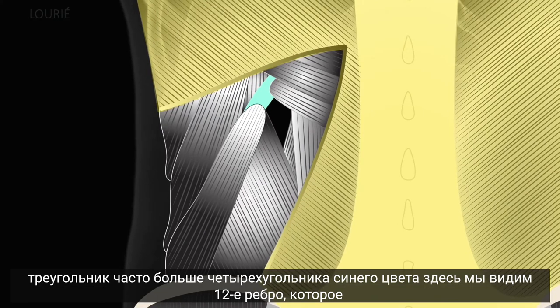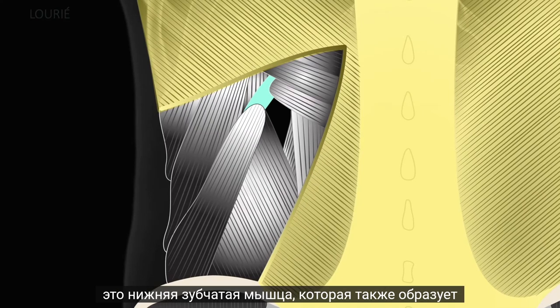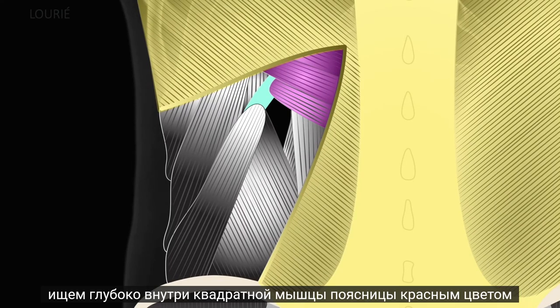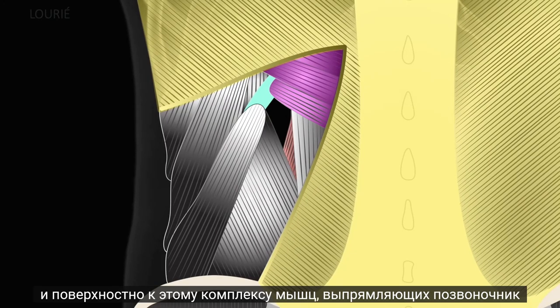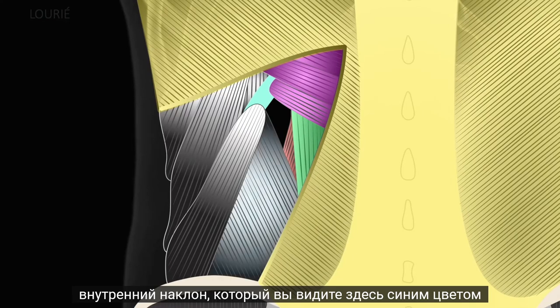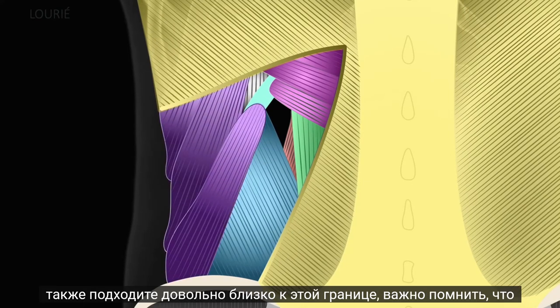In blue here we see the 12th rib, which forms its superior border. There is a serratus complex, in this case the serratus posterior inferior, that also forms a portion of this superior border. Then medially, we look deep inside for the quadratus lumborum in red, and superficial to this, the erector spinae complex here in green. Its lateral border is formed by the internal oblique, which you see in blue here. The external oblique muscles, shown here in purple, also come quite close to this border.